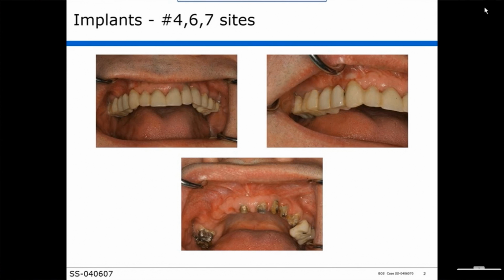You then remove the tray, pour the stone model. Do not remove the model from the tray. You now scan the tray in your scanner. As you can see, that merge will be absolutely perfect, where the gutta-percha points are entirely in a different plane than any scatter you could possibly have. So you get dead-on merges every time with that system. Scatter is a big deal when it comes to merging files if you're doing optical scanning. By doing these methods, scatter is absolutely irrelevant to our merges, and we have phenomenal confidence in our merges.